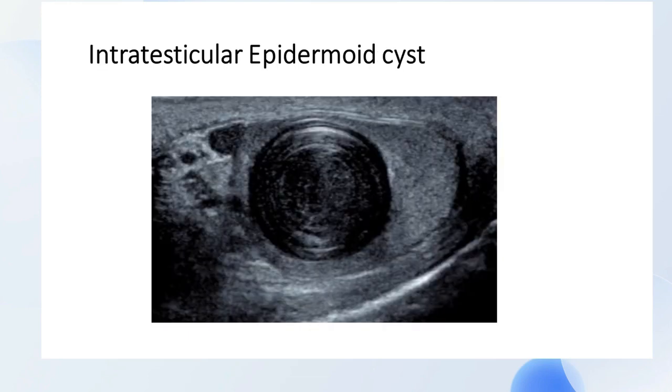So again, this is an intratesticular epidermoidal cyst. You can see how it appears like a bullet that is piercing like that. This is an epidermoidal cyst, though it is intratesticular, but it's a benign lesion.